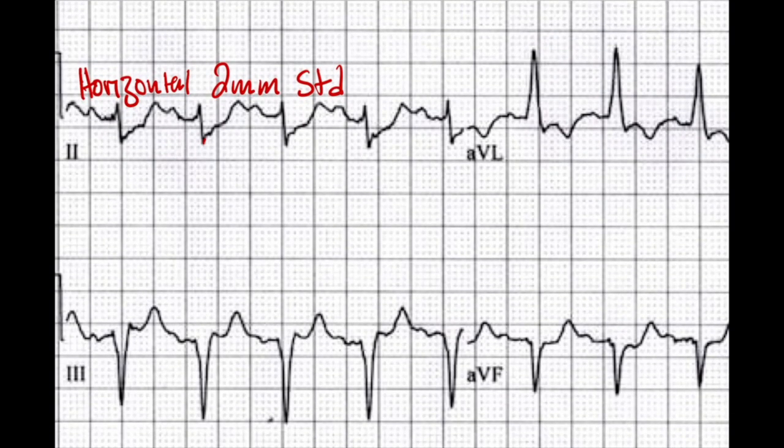Let's start at the P wave as always. We have a P wave, and it looks like we have a tiny R wave. It looks like we come up, so we have an SR prime complex. But then as it comes down, we flatten out. That's not the baseline.